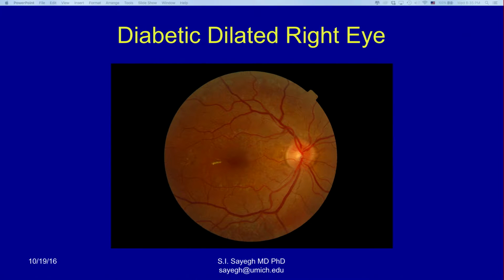Yes, it's very close to the center of the vision, so this eye is in danger. It does have some blood bleeding here and so on. And, well, maybe it's a good sign. It has already been treated. Maybe 2 years ago, I don't know when. But not yesterday. So you have all these things that you may want to pick up.